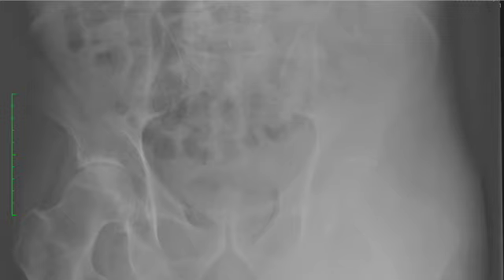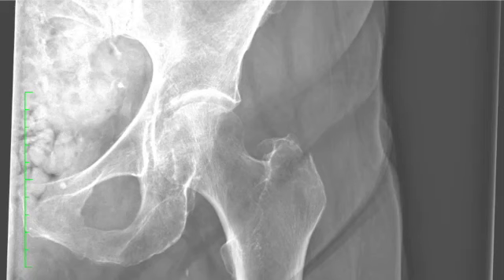And this is a poor radiograph in how it's imaged. We poorly visualize the left hip on this radiograph. We always want to have the smallest field of view possible to better visualize any abnormality. So here is a much better imaged radiograph of the left hip in the same patient.